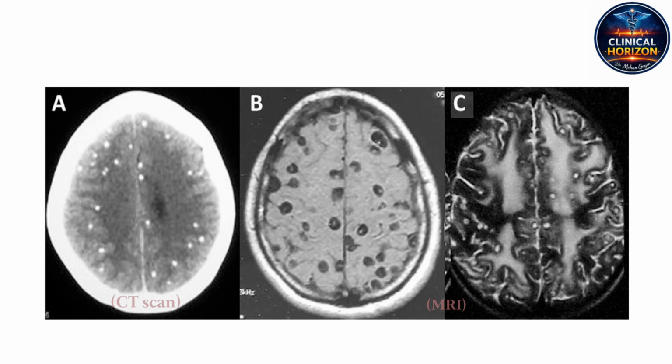The imaging here traces 4 distinct evolutionary stages. Starting with the vesicular stage. Right, where we see clear cystic lesions. And inside several of these cysts, you can actually identify the hole with dot sign. The dot being the hyperdense scolex. The head of the living parasite. It is incredible that we can visualize the actual anatomy of the parasite in vivo.